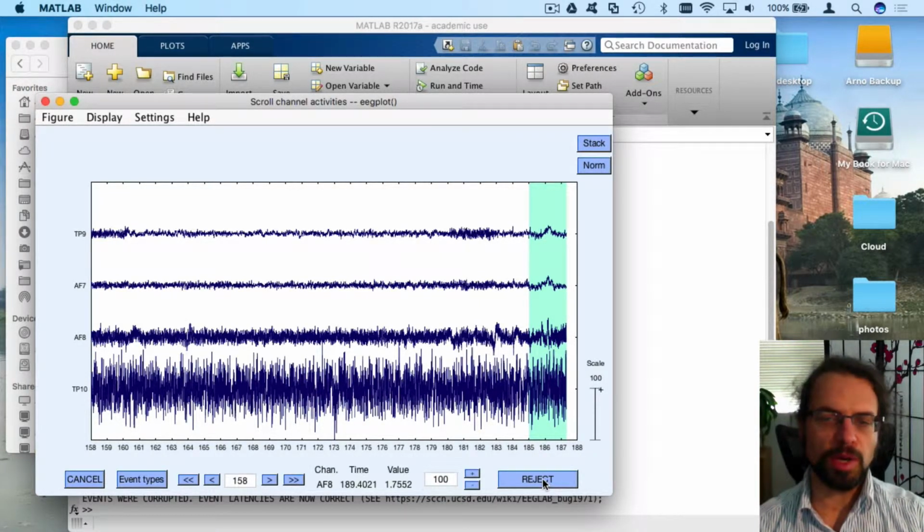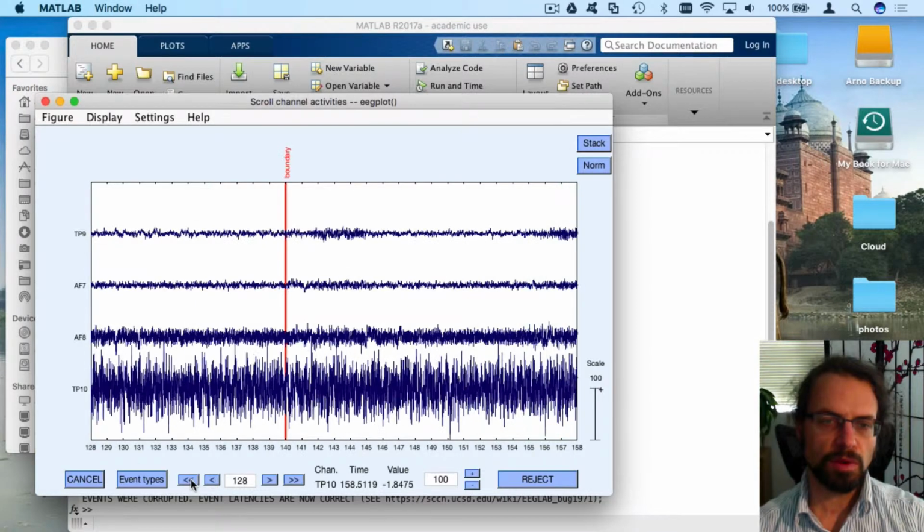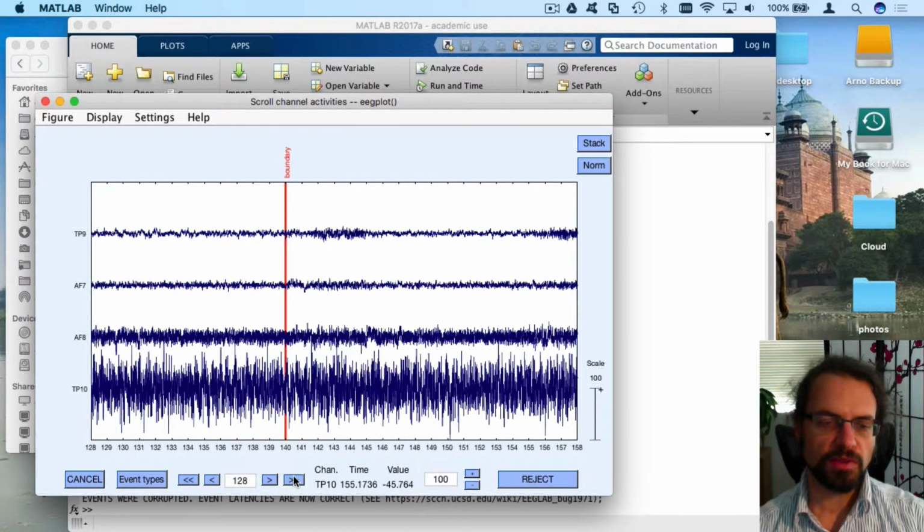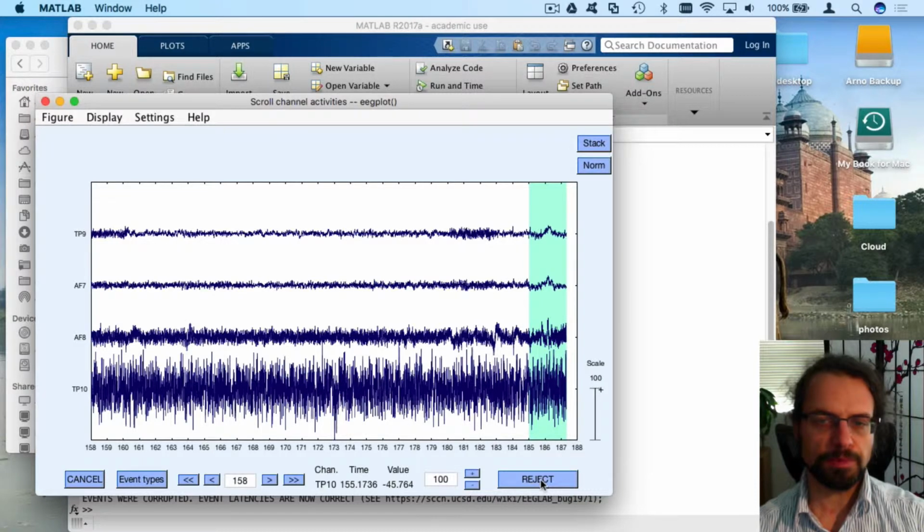Plus, I know that if I'm left with a segment that's about 1 minute, which is the case here, that's 20 seconds, plus another 30 seconds here. So we have about a minute, 2 minutes of data, and that's enough. We don't need more data than this.